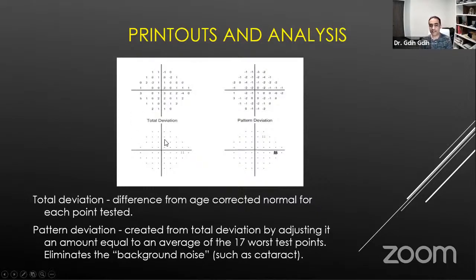What it does is look at the visual field as an overall. Overall, there's a reduced sensitivity, a general sensitivity, but it does not point out the real loss versus the reduced sensitivity coming from media opacity or other things going on. And it's more specific when you have a patient with glaucoma and a focal visual field loss and cataract at the same time. So this total deviation will become all black.